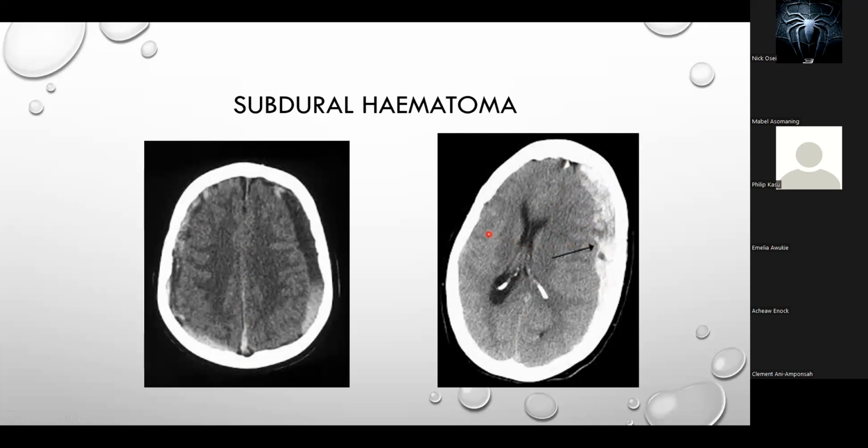So such a patient needs emergency surgery, burr hole and drainage. Otherwise, the patient is likely to die. I hope you can all see that.